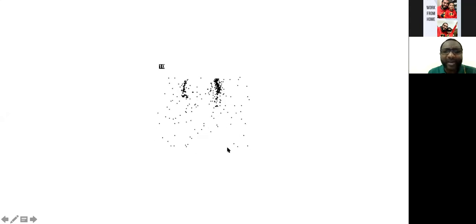This is an example of a patient who presented with pain, a 20-year-old gentleman who is a footballer and presented with severe pain in the lower limb. His x-rays were normal. So we did a flow study. You can see that his flow is normal. I cannot see any evidence of abnormal localization. We usually put a marker sometimes here to say whether this is a right or a left. You can see here the space where the arrow is.